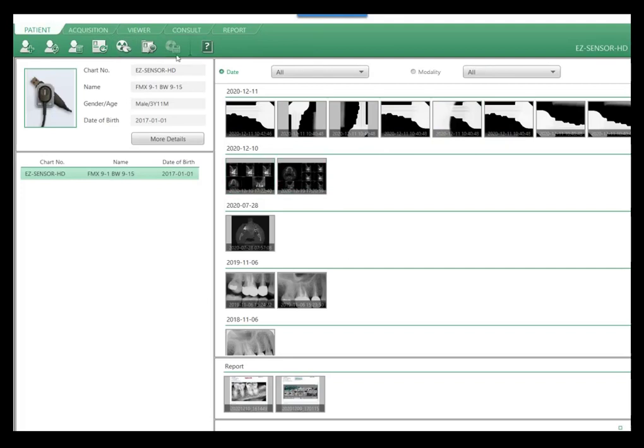All right, Paul, I think you're going to go through some viewer stuff. Is that correct? Yes, absolutely. All right, let me get over to, let's look here.